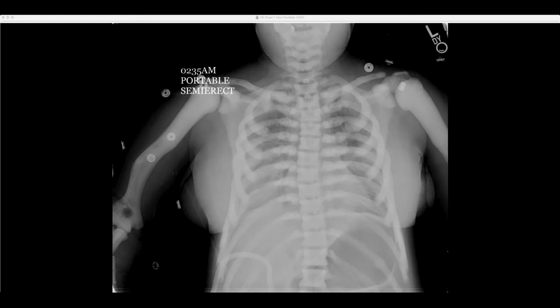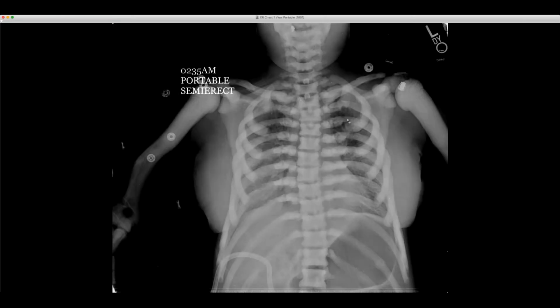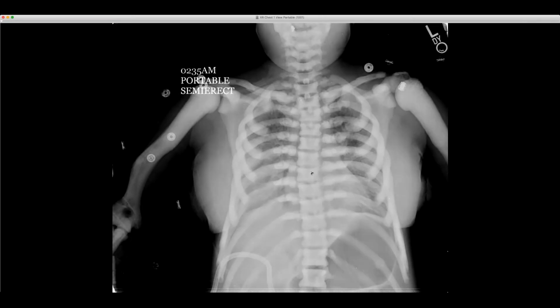So this is just a really quick one. Let me pull up the screen here. All right. This is a young patient with this chest X-ray, and you can immediately see that there is really, really dense sclerosis of all of the bones. Our residents are very good, but when this popped up, another resident asked, "Oh, could that just be artifact?" And I was like, "Well, this is not."